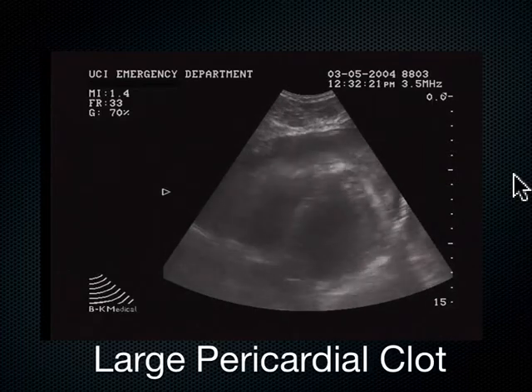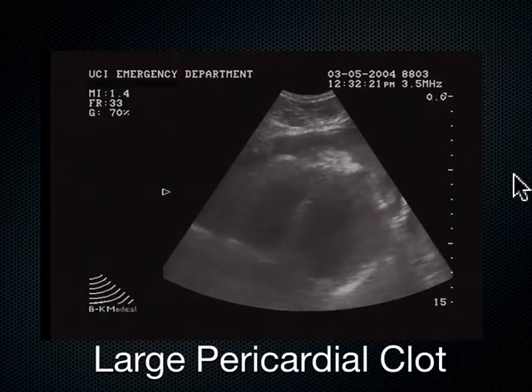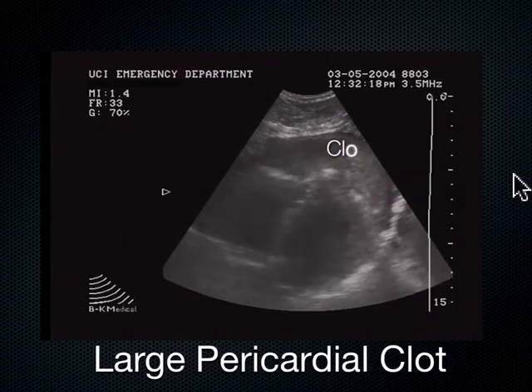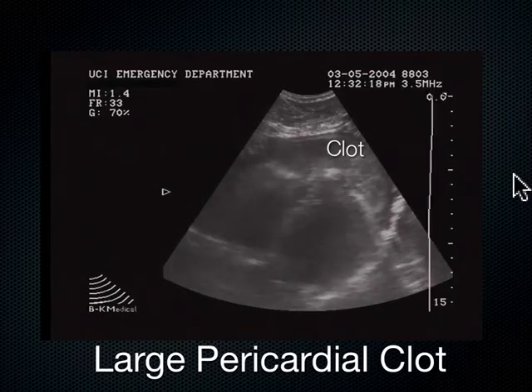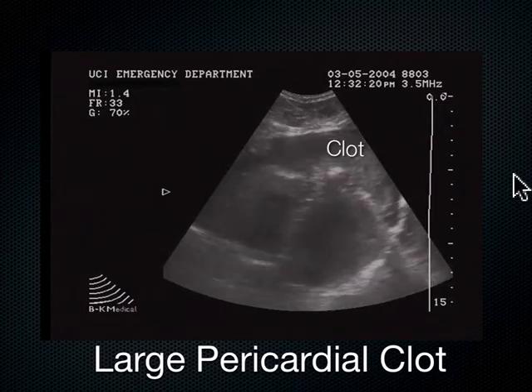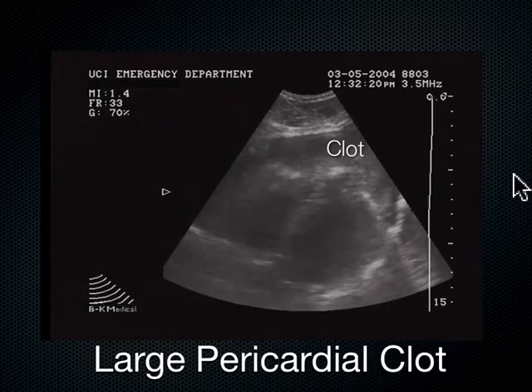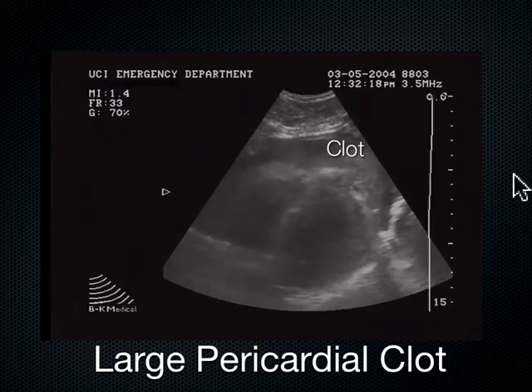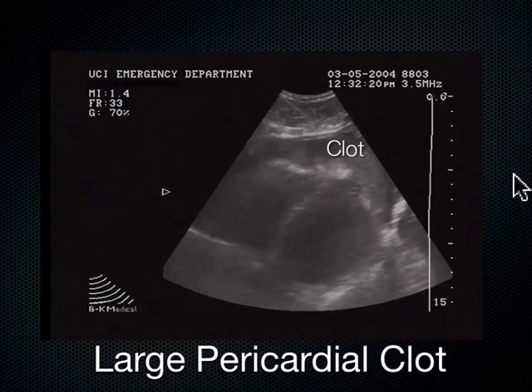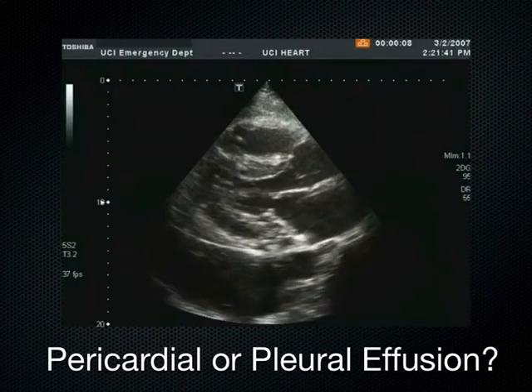This is clot. Hard to differentiate the two, and you're going to run across this more than really anything else. But is fat going to ever collapse the ventricle like that? Fat should not cause the ventricle to collapse, no. Very good point. So I see the tamponading ventricle. I see more than 1 centimeter thickness. I see an isoechoic substance in the pericardium. And I really start to make the case that this is a clot. And I see that the patient had a transmediastinal gunshot wound. No, I'm just kidding. Clinically, I am correlating.